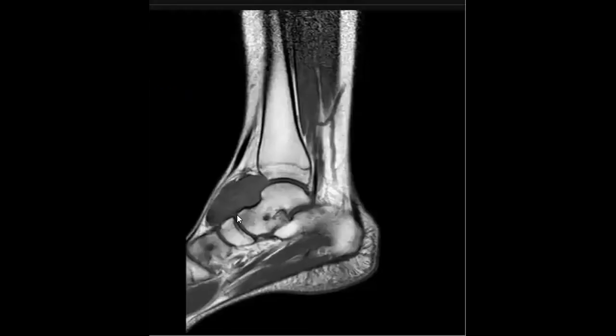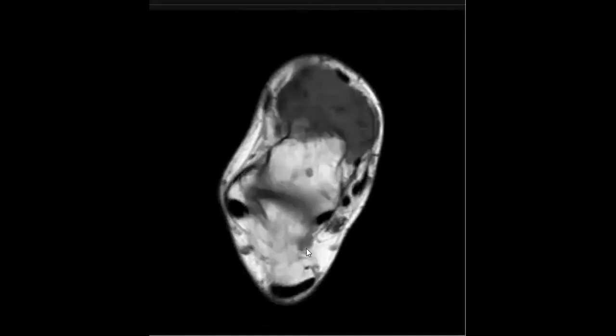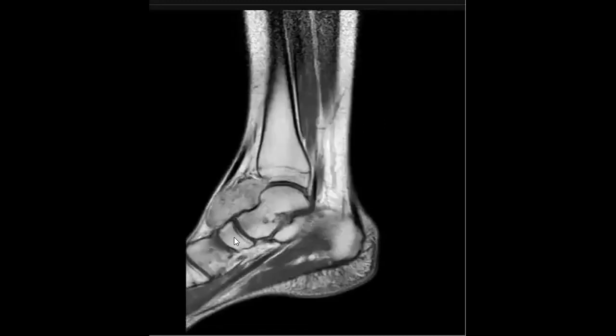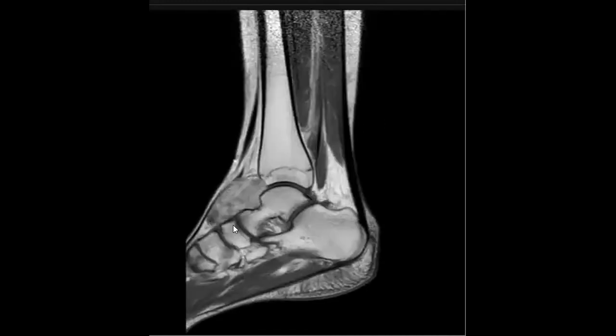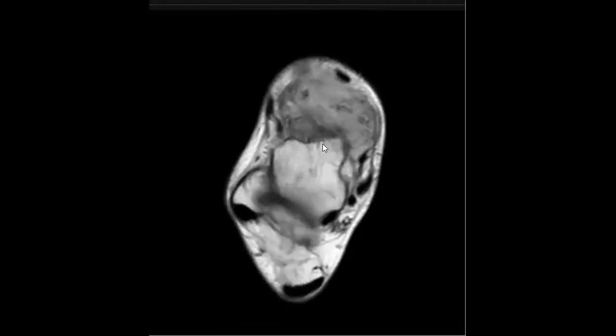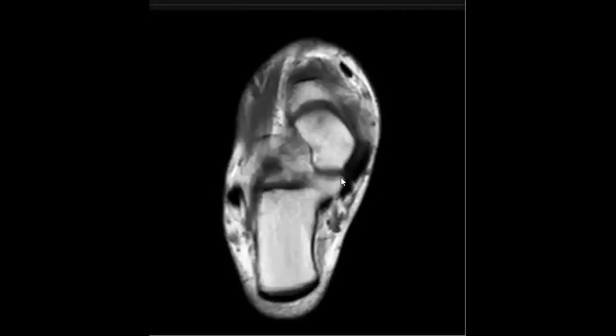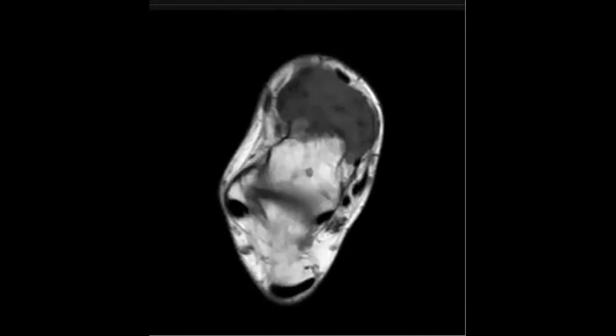I think on the T1, you will describe it as a soft tissue lesion. So if I ask you what the best sequence you would like to check, sure that you will ask me for post contrast. I will show you the post contrast. So this is T1 post contrast and this is T1 pre contrast. The post contrast shows that this patient has an enhancing lesion. So the differential diagnosis could be wide. To narrow the differential diagnosis, what sequence would you like to ask for?